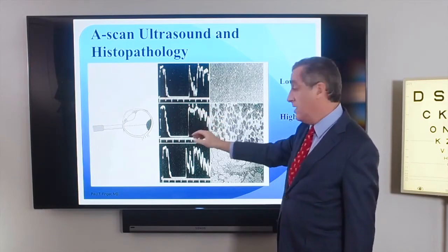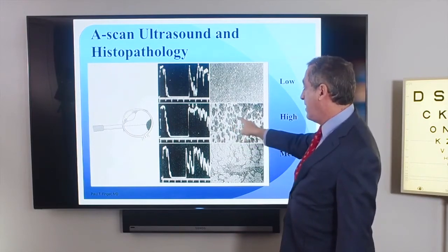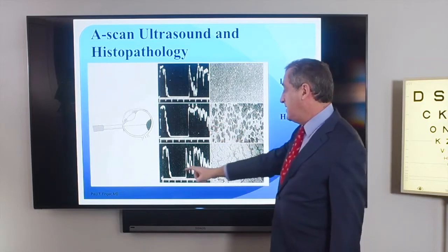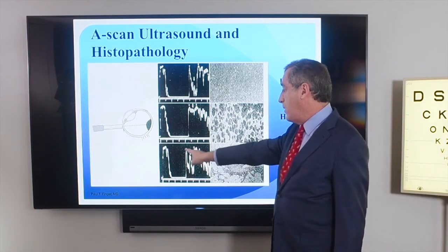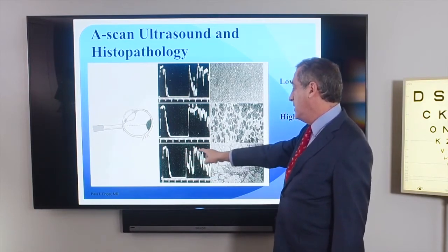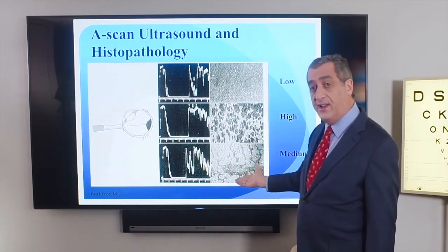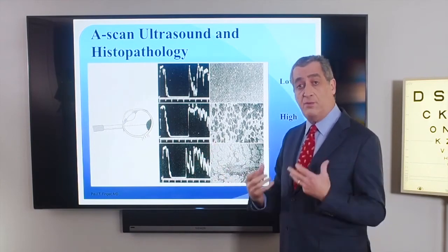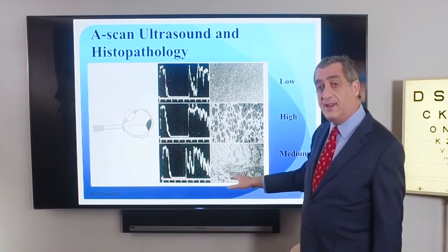In contrast, this A scan, we go to the tumor apex and the sclera, and it's very high internal reflectivity. That's consistent with choroidal hemangioma, where there's a lot of vascular spaces in the tumor for reflections. Lastly, we have an example where we have the apex of the tumor and random spikes in between. This is classic for a metastatic cancer, where say, breast or lung has fibrous septae, which would be in the tissue causing those intermediate spikes.